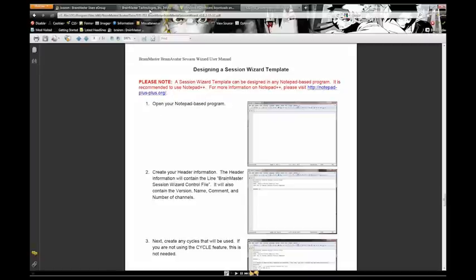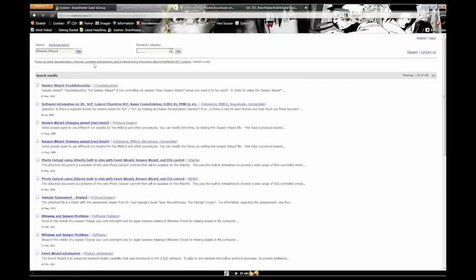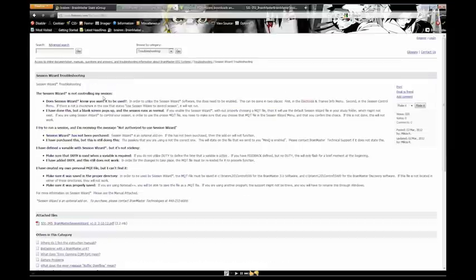I do want to mention some other resources we have, and I forgot to go over this in the EventWizard webinar, but the knowledge base is great for things like that. For example, if I type in SessionWizard and hit go, you're going to notice the very first result is SessionWizard troubleshooting. This goes over some of the different things that may or may not occur in the system, some ways you can figure out what might be going on, and some things that could go wrong.